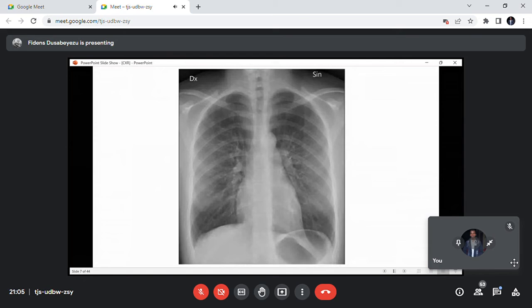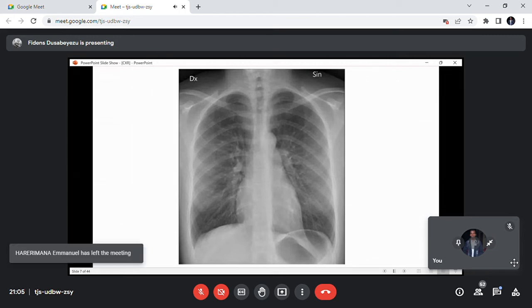In your mind, any abnormality on those anatomical structures listed. You are not fixed on one thing. You are checking: the trachea is central. The upper mediastinum is normal in size. The great vessels, you have said, are normal, not distorted. There is no deviation of the mediastinum. The heart is normal in size and configuration. There is no dilatation of the esophagus.